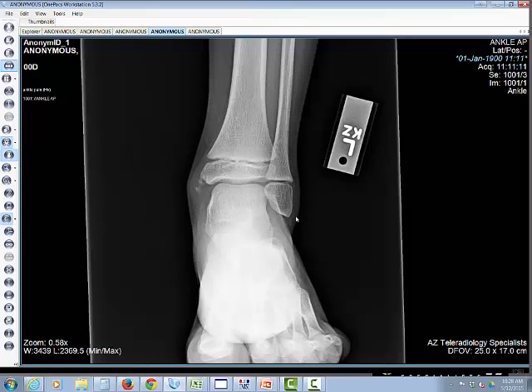I'd also like to talk a little bit about the lateral malleolus. This is, of course, a common site of injury in pediatrics, and it can be difficult to diagnose a subtle Salter fracture here. There can be quite a bit of anatomic variation along this growth plate and along the metaphyseal corners. There may be small punctate areas of calcification. The physis itself may be undulating, and you can see some irregularity on that basis.